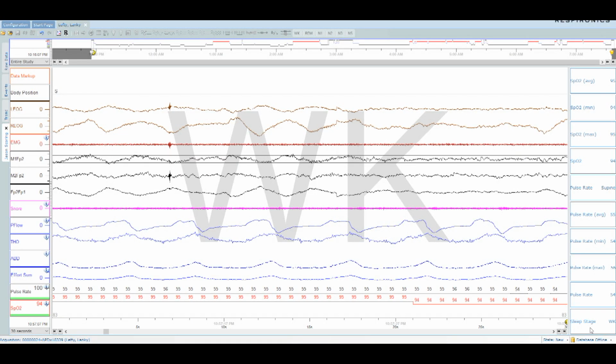This is the second video in my scoring series, just for the iNAP comparison. iNAP being the intermittent negative air pressure therapy that I did. So this is the secondary study, so this is a secondary video. The first video I did was on the sleep staging. Now this is going to be respiratory.